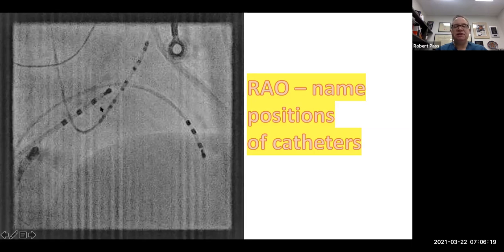And this patient actually did have AV nodal reentry. And so the first applications were actually made at or even below the level of the mouth of the coronary sinus. And these did result in junctional acceleration, consistent with being near to the slow pathway. Okay. All right, let's move on.